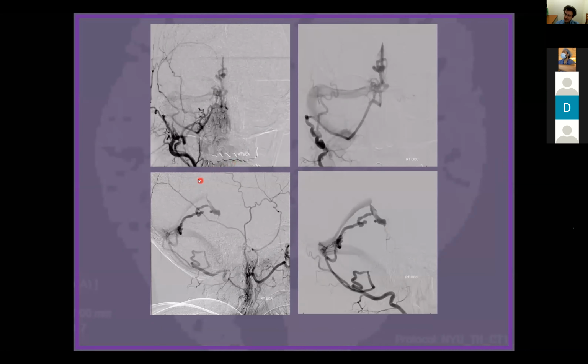And this is the kind of fistula we want to get back to. Where exactly is this fistula? It's not a fistula that seems to involve the sinus. Here are all these arterial connections to it, and then there's this tuft of vessels. And then you see the structure here, and that's the superior vermian vein, coming up and draining via the Galen into the straight sinus. So this is what we would consider a fistula that's located on the tentorium.